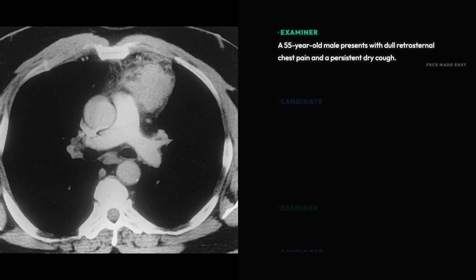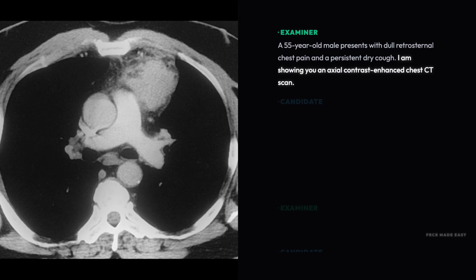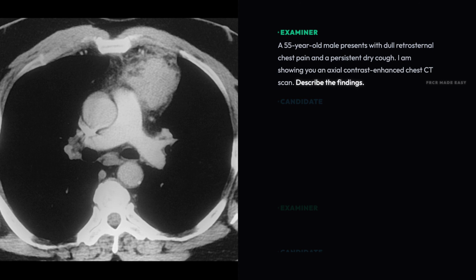A 55-year-old male presents with dull retrosternal chest pain and a persistent dry cough. I am showing you an axial contrast enhanced chest computed tomography scan.